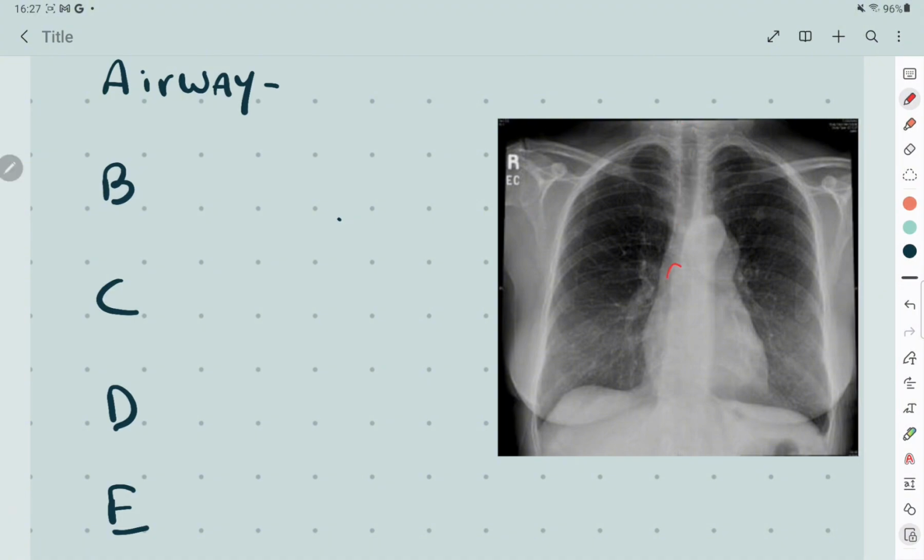Look at the carina where the trachea splits. This is your target landmark for checking nasogastric tubes. An NG tube must bisect the carina to be safe. Notice how the right main bronchus is wider and more vertical. That's exactly why inhaled foreign objects almost always end up on the right side. Finish A by looking at the hila. The left hilum is usually slightly higher. Look out for bilateral symmetrical swelling, which screams sarcoidosis, or asymmetrical swelling, which points toward malignancy.